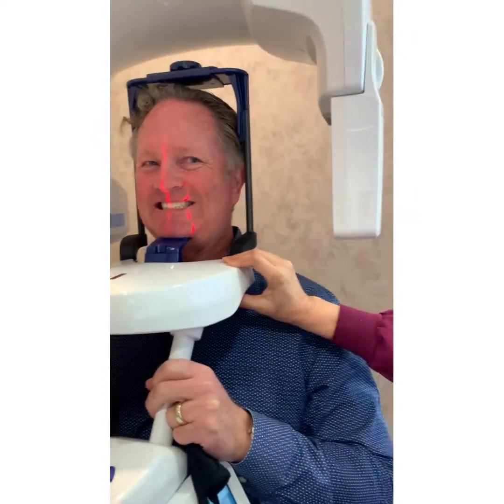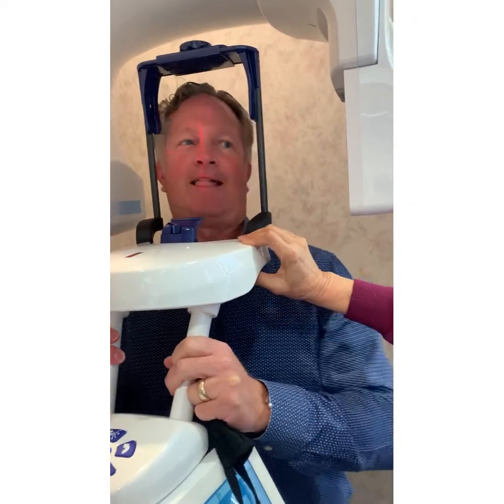You can take your own. Same lineup like the pan, that makes it easier.